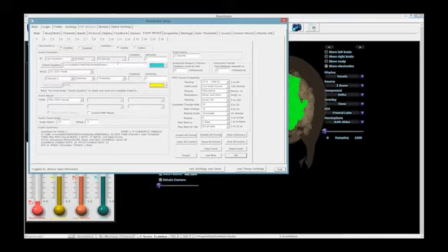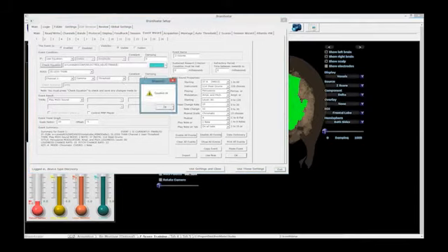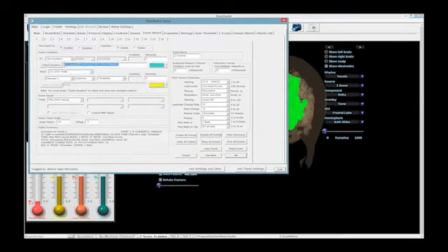So what I'm going to do is I'm going to go right here, and I'm going to type in select ROI. And I'm going to type in select band. Now, for those of you who don't know what this is, I'm going to hit Control C, I'm going to actually save this over all my other ones so that everything is the same.